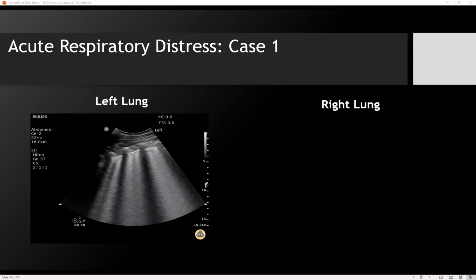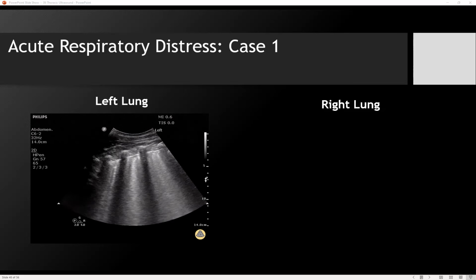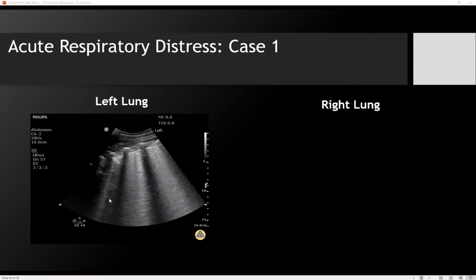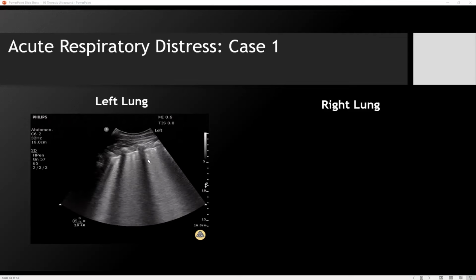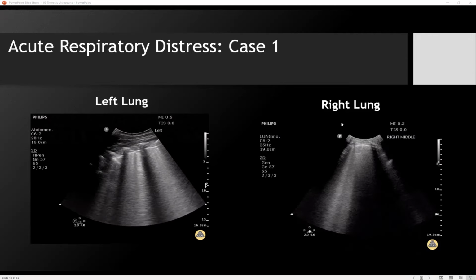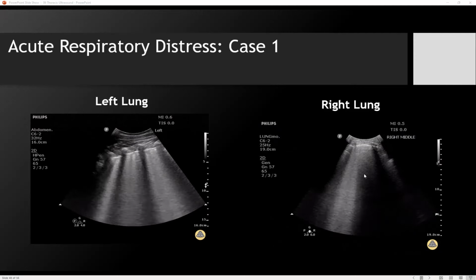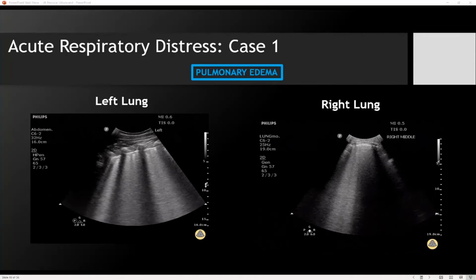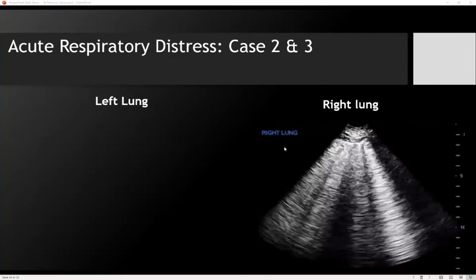I'm going to call on people if we don't call on some fellows. Elnardo, what are these? So I see B lines. Yeah, throughout. It's lung. We can't get more complicated than that. And then how about here? Yep. Also B lines. So what does this patient have? Also B lines. So this would be probably fluid. Yeah, or pulmonary edema, maybe ARDS, maybe fluid, whatever it is. But you've diagnosed, so to speak, pulmonary edema. All right, great.